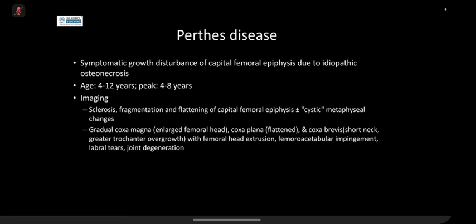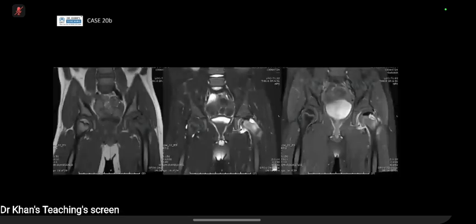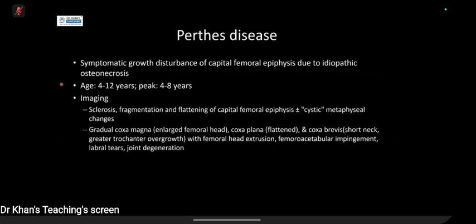Now, coming to the metaphyseal cysts we saw earlier, people don't really know what they are due to. There are some theories that they could be due to growth plate disturbances, because you've got the femoral head necrosis, so these tongues of physeal cartilage have protruded into it, and because of the changes in blood supply, these are areas of unossified cartilage which have persisted, causing these cystic-like appearances.